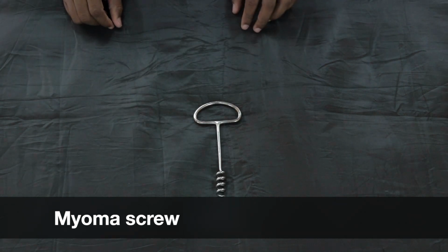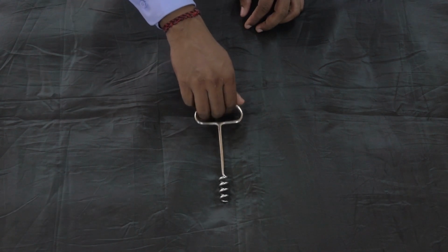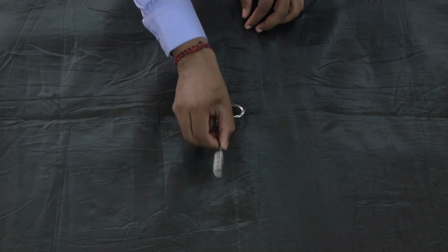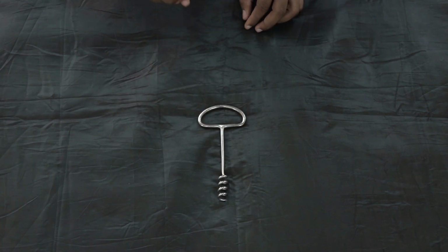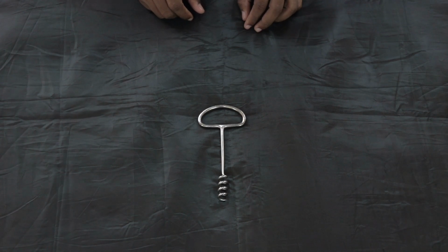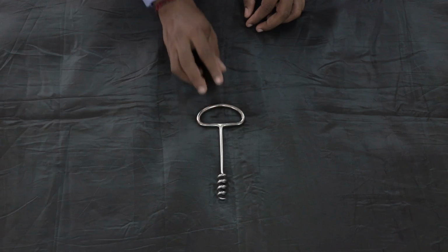This is called Myoma screw. It has a handle and a shaft, and there is a screw with a sharp tip, which is used to hold the fibroids during the myomectomy surgery, and it can be used to hold the uterus during the hysterectomy also.